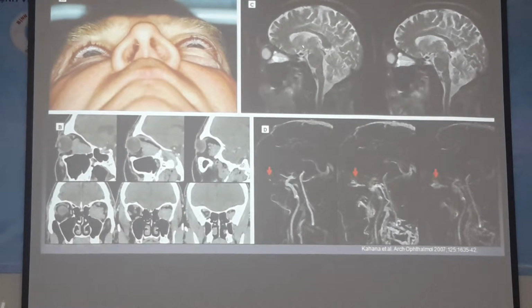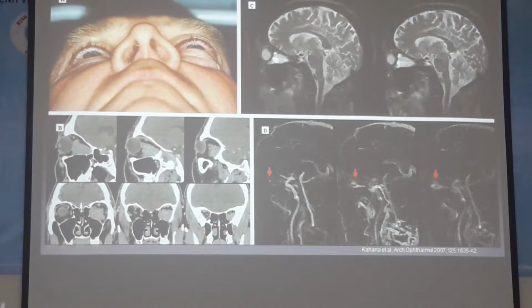And remember, this is taken with the patient lying down, so this is going to be the top of the lesion. And so it suggests to us that this could be a vascular malformation, but it doesn't prove it to us.